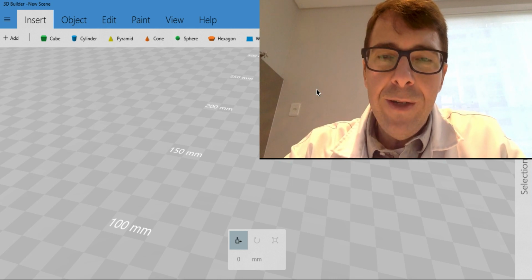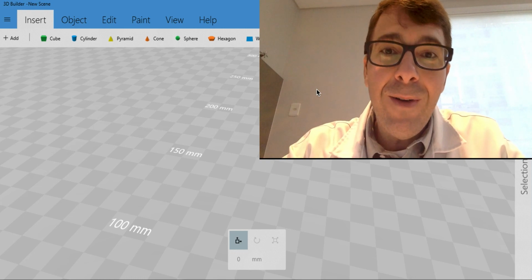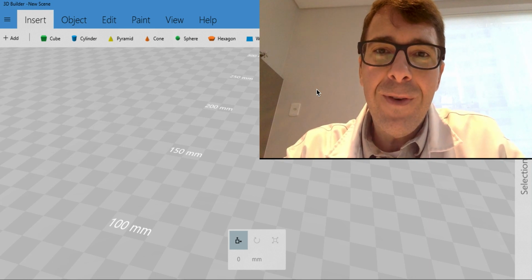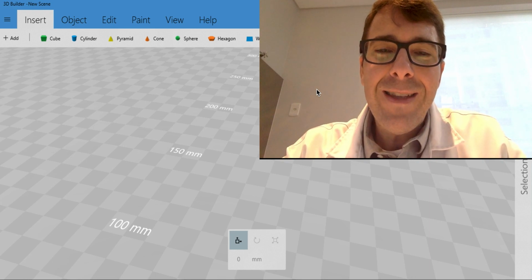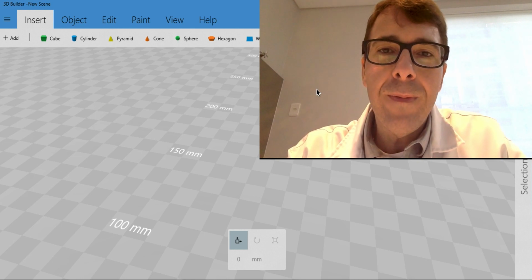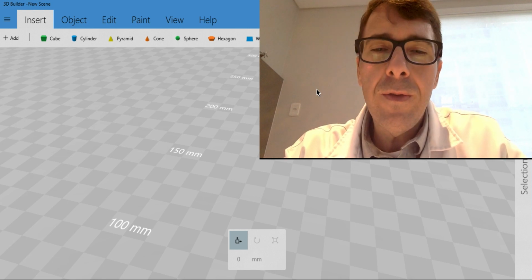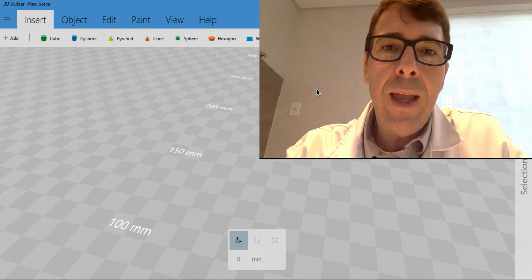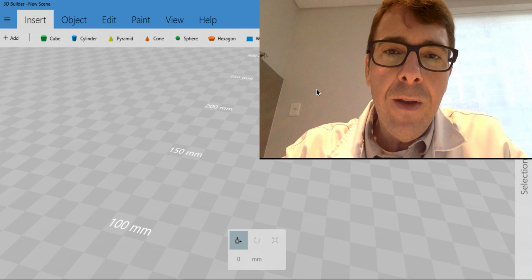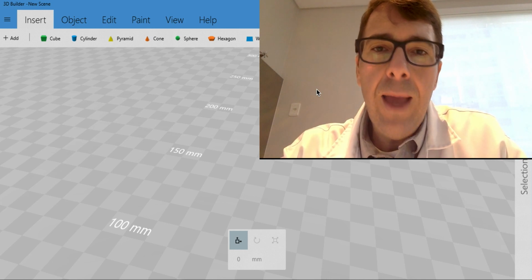I'm speaking from Brazil. First of all, I would like to excuse the quality of this video and principally the audio. I'm recording at the request of a friend who asked me to show how I can plan a surgery using a very simple software in Windows called 3D Builder. It's in every Windows 10 computer. So we are going to show how we can plan an osteotomy. For this case, we are going to use the Latarjet procedure as an example.